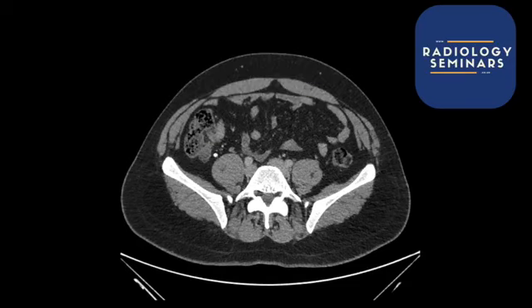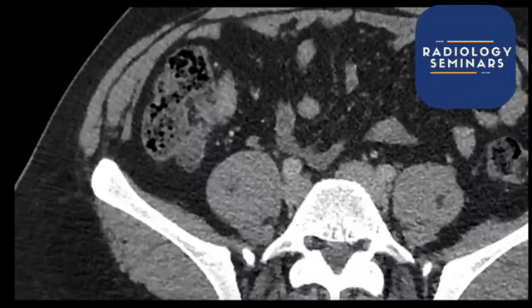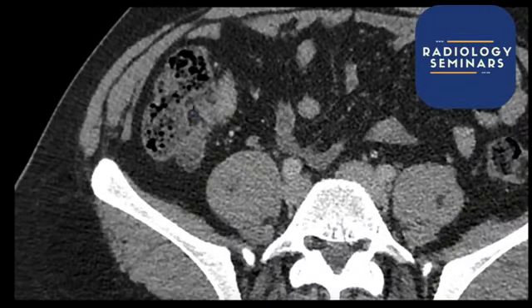I'm going to zoom in on this bit here because I think it's a very useful skill to have. So, the ileocecal valve has got a bit of fat around it, this valve-like thing here. Fat, what colour is fat? It's the same colour as this over here. Well, similar. But you'll see almost like a lip-like structure, low-density lips there. So that's going to be the ileocecal valve.